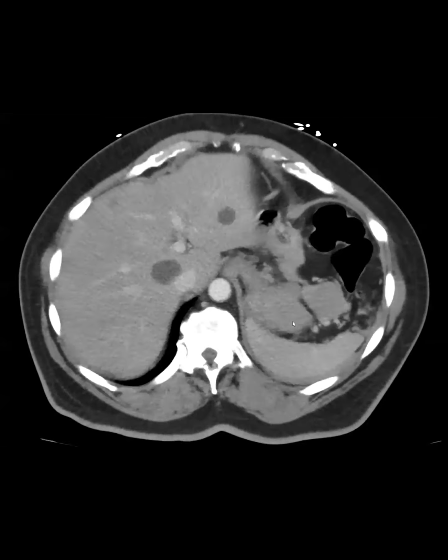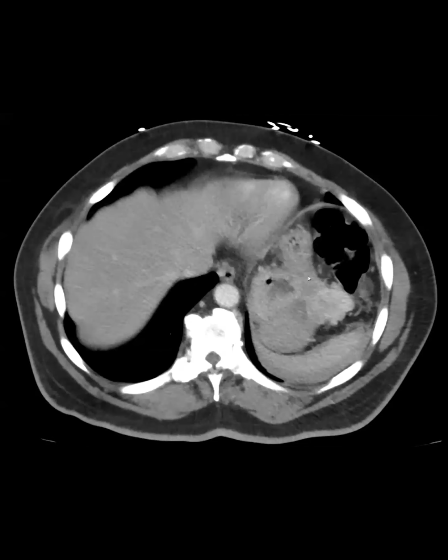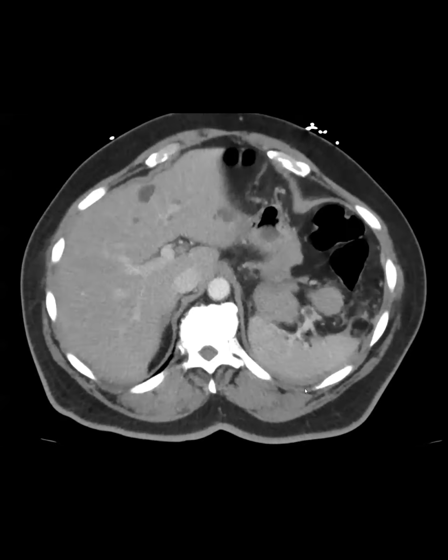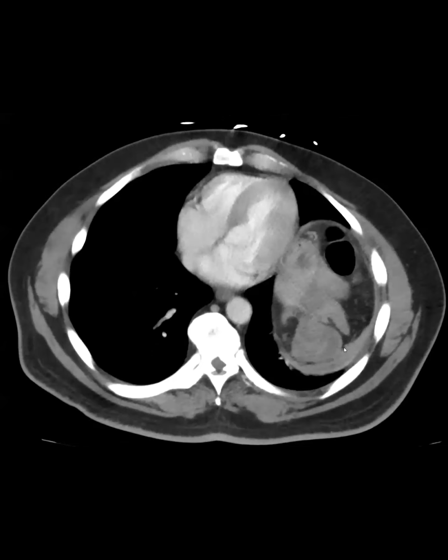So this one is in this space. I would say it's separate from the pancreas down here. It is touching the stomach. Maybe it's a gastric primary. It is briefly touching the colon, and then there is some blood and hyperdense stuff around the spleen, but probably not from the spleen. So what do you guys think? Like a bleeding GIST, maybe.